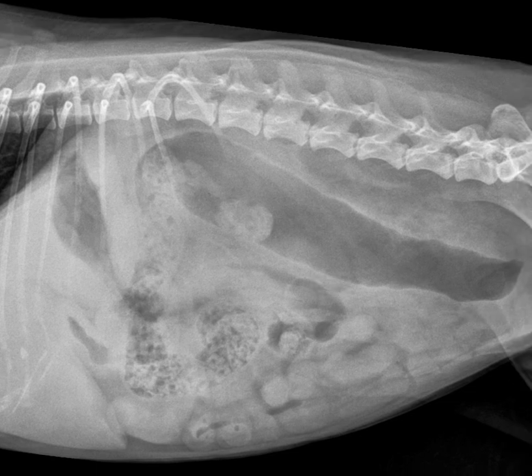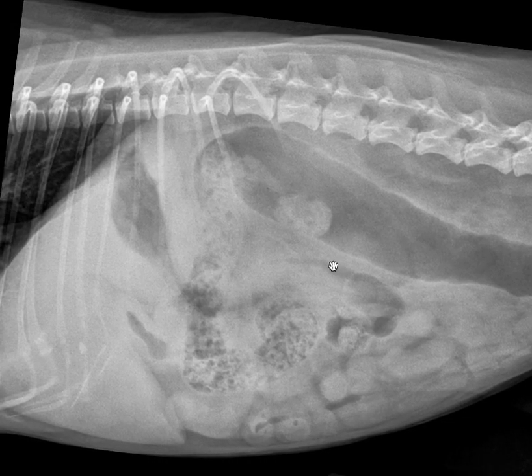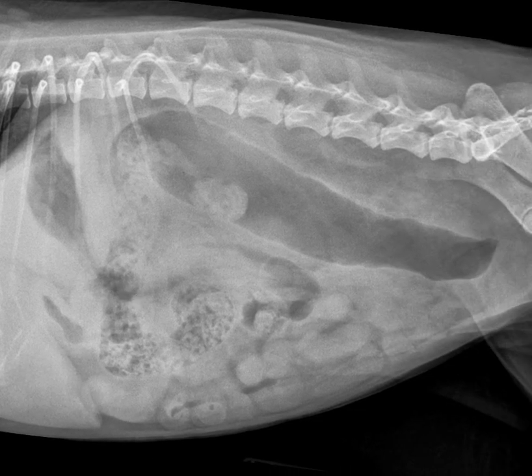I would also say that there's mild mid-abdominal serosal detail loss, although I'll point out that if we look in the falciform region, there's very well-defined margins of liver, and in fact, the liver is a little big. So my second conclusion would be questionable gastric mural wall abnormality.